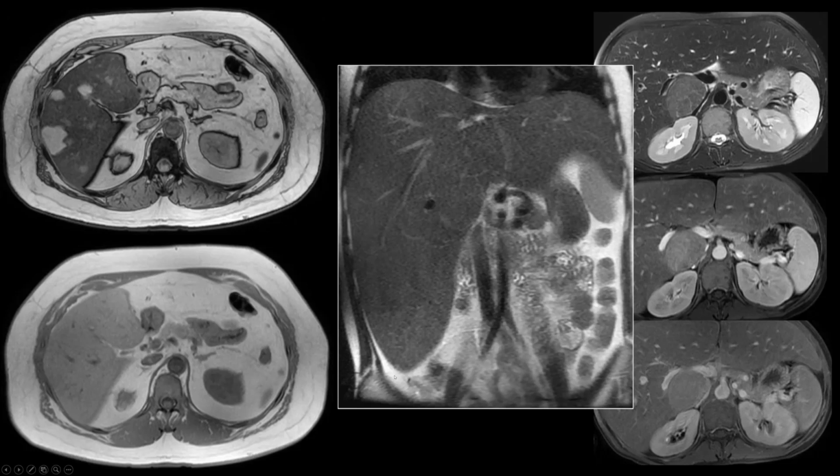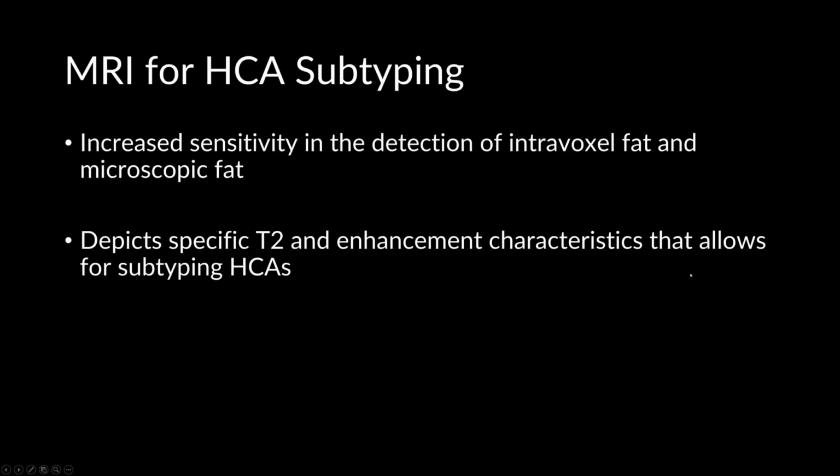It extends beyond the iliac crest. And I look in the patient's chart. This patient is a male with glycogen storage disease. So this nonspecific lesion will probably be an adenoma. So those are always helpful clues as far as how to characterize these lesions.